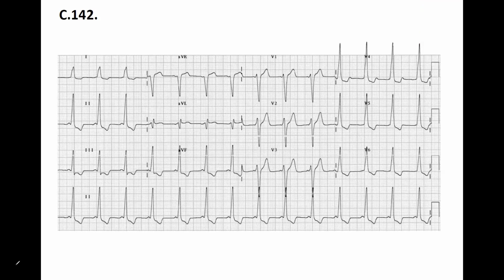So I think this is a regular rhythm. A normal heart rate. P waves are present. It means we do have about 80 or 85.